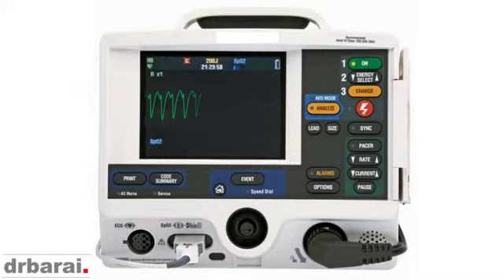But in front of us, when there is a collapse, the first thing we check is if there is any palpable pulse or not. If there is a palpable pulse or a recordable blood pressure, obviously we need to seek and treat the cause, for example, hyperkalemia or sodium channel blocking drug overdose. However, if there is no pulse and no recordable blood pressure, if the patient is in a cardiac arrest, we need to consider this as a VT until proven otherwise.